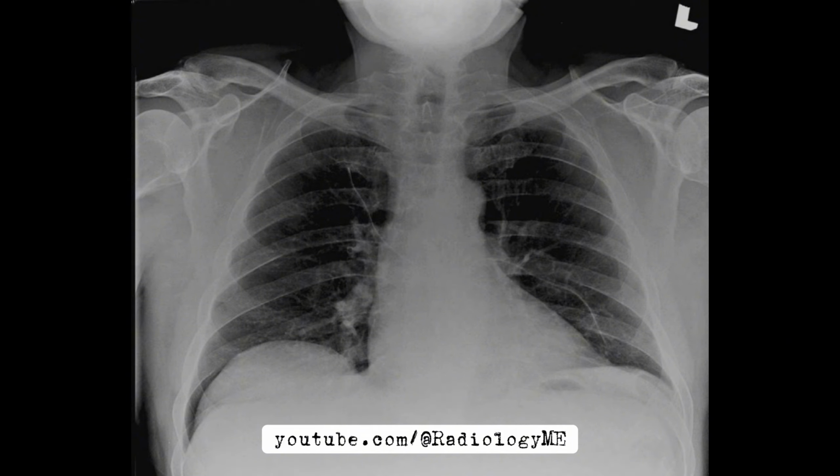The differential diagnosis here is really limited, to be honest. The only other thing we'd consider is whether we're looking at an artifact, something external like a wire or tube that's lying on the patient's body, but that's unlikely. The pattern of the line suggests it's inside the body, not on the surface.